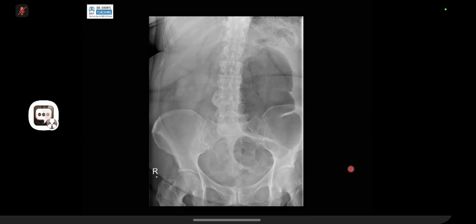Now cecal volvulus. If you see here in cecal volvulus, the concept is that the anatomy is at fault. Please remember the cecum has a mesentery, and these people will have an inborn, large mesentery, and that is why the cecum moves. Interestingly, it will move classically to the left side, left upper quadrant, just like this case. It moves there and then there is a twist with it, right? But key exam point, look at the haustra and you've got a differentiation.